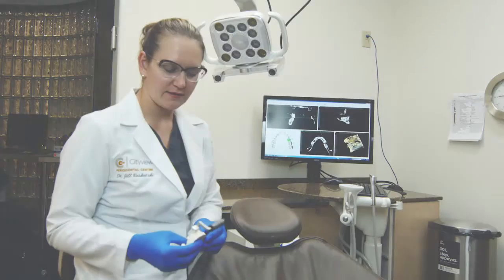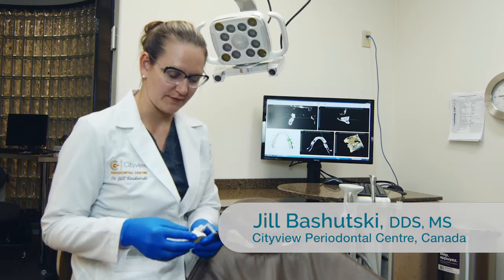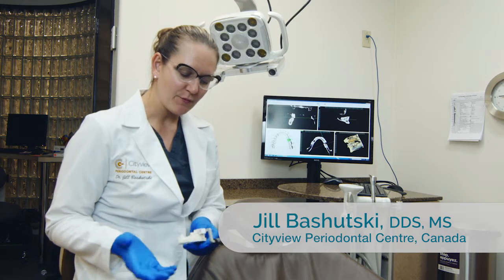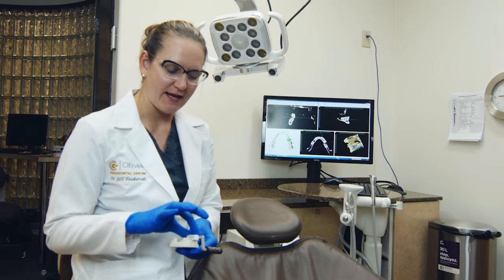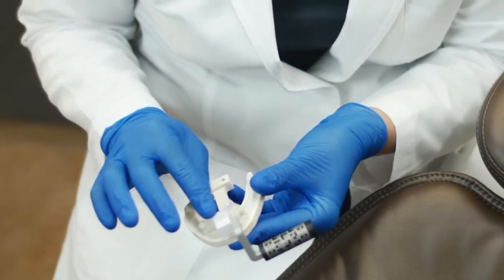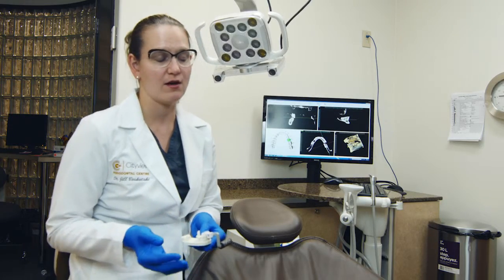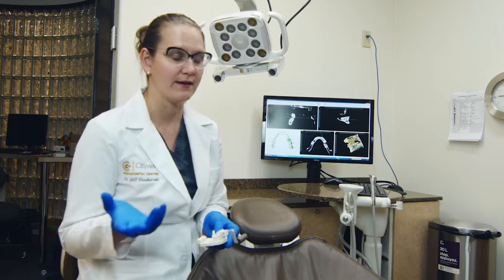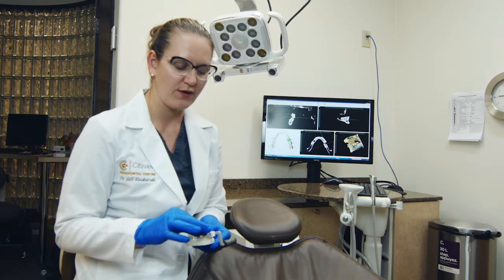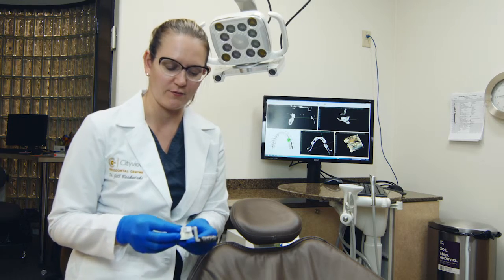So I use the Inliant clinical system to help me place dental implants without the use of a static stent. How it works is I scan a patient using a CBCT scan with either a lab fabricated stent like this one, or just something I make in the office with, for example, Triad, or any material that you can attach to rigid teeth that is non-movable.